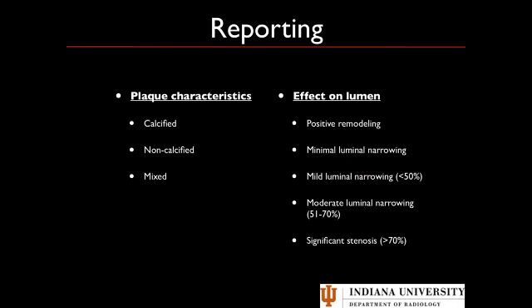So there's a couple things I want to talk about when I talk about reporting. One is whenever you find a lesion, you want to talk about what the plaque characteristics are, whether they're calcified, non-calcified, or mixed. You'll find that the majority of plaques are mixed or even purely calcified. The purely non-calcified plaques are relatively few and far between. However, as a new learner, these are some of the ones that you're going to most easily miss. And I've seen lots of participants in different courses totally miss a significant stenosis due to a purely non-calcified plaque. So pay very close attention to evaluating for non-calcified plaque.